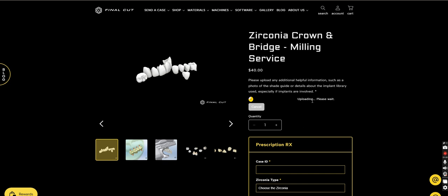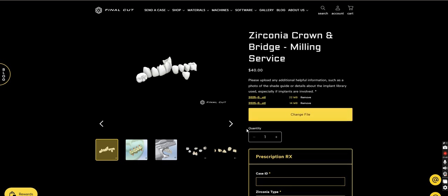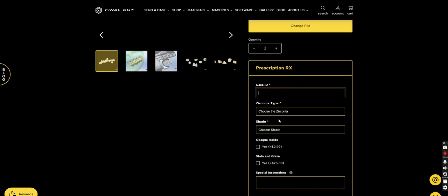Once the uploading is ready, I'm going to select the quantity. Here I uploaded two single crowns, so the quantity is going to be 2. Let's go to the prescription RX.